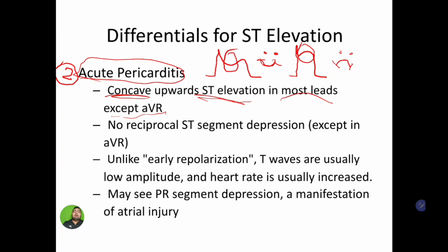Now let us see, I have made a funny illustration. Whenever you find a patient in the emergency or casualty in the middle of the night, suffering from very severe chest pain, you see tall ST segment elevation in most leads and you get frightened.